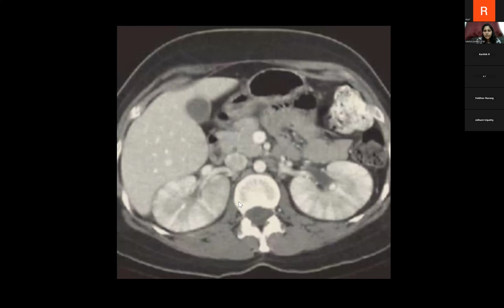Okay, why do we call it that, for the other students? Why are we calling it striated nephrogram? Because here we are seeing the linear hypodensities. This is not how a normal nephrogram is supposed to be. Here we should be seeing uniform hyperdensity or uniform enhancement of the cortex. But instead we are seeing the linear hypodensities in between, giving the striated appearance or striations.